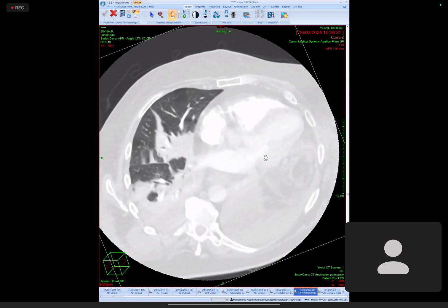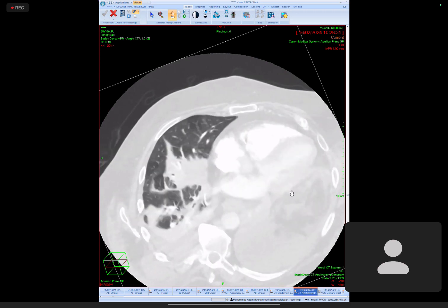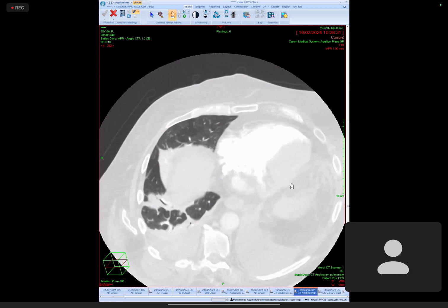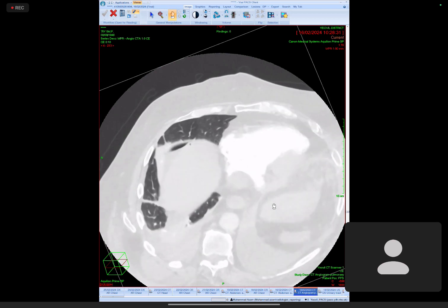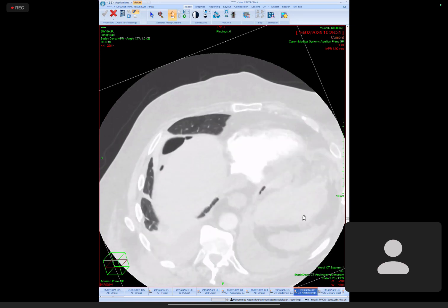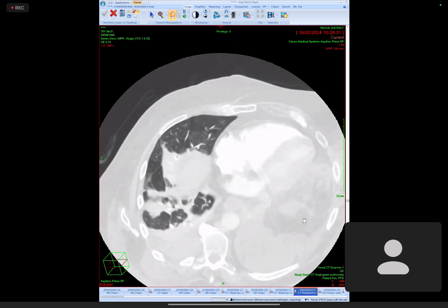I haven't been able to get to a conclusion for this, but this can be because of the increased hydrostatic pressure in this patient, because I can also see some subcutaneous edema, and there's no obvious lung finding except for fissural thickening on the lung window.